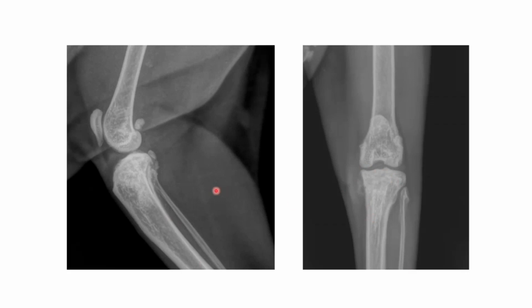And this is just a nice example of how osteosarcomas can sometimes look predominantly proliferative rather than destructive. So there's a whole range of different appearances for osteosarcoma. Sometimes they're highly destructive and there's a huge amount of lysis of the bone associated with the lesion. Other times they're a little bit more proliferative, and in areas it appears there's maybe more bone than you'd expect to see. So the bone is more opaque than the adjacent unaffected bone. And I think this is a nice example of that.